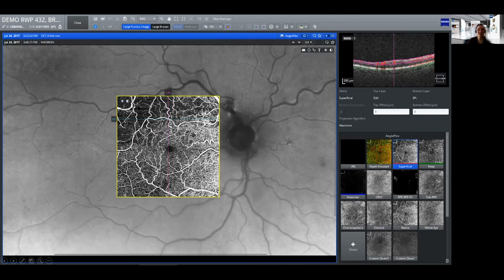That is also something that is not easy to see on a fundus image. It is much easier to see on an OCTA where you're actually keeping track of blood flow and where you can show to your patient where the damages occurred, why they may have issues with their vision, so they can better understand what is going on.